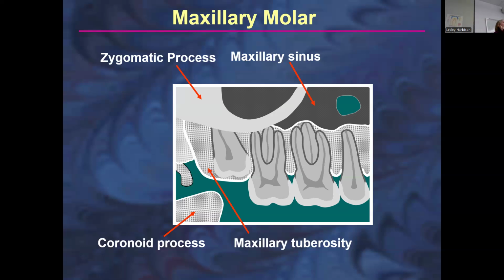Well, the condyle is the part that goes in. I said it wrong. If you think about things long enough, you'll correct yourself. The condyle is the part that is in the articular eminence, but the coronoid process is the front part. So on your jaw you have this back part in the TMJ and then it swoops forward.